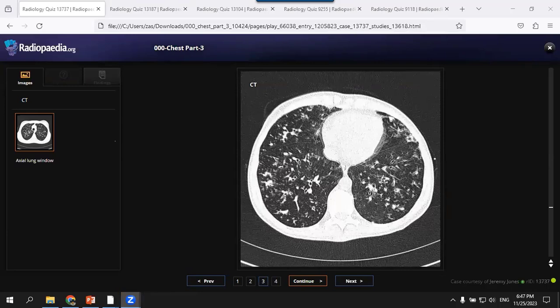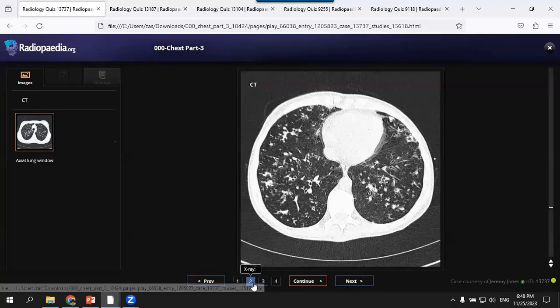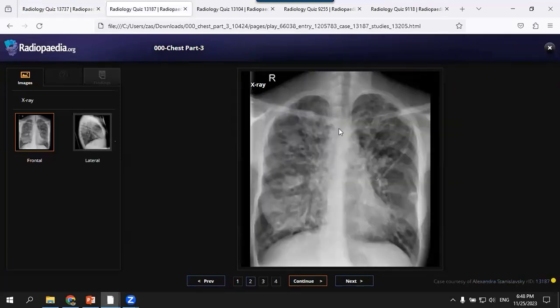The next case for you. Frontal chest radiograph, skeletally mature patient. There is a left-sided central line. Is it peripherally inserted? No, it's a central line. Usually, this pattern is tunneled under the skin, maybe with a classic port-a-cath or permacath, or maybe not. This is usually tunneled under the skin.